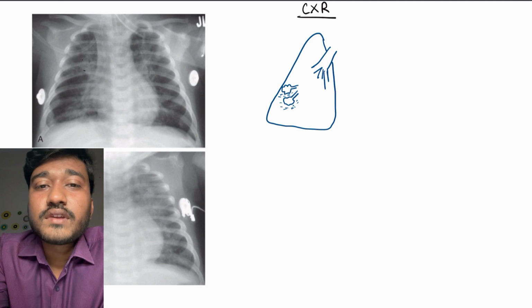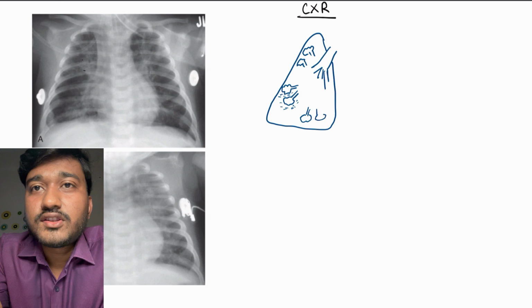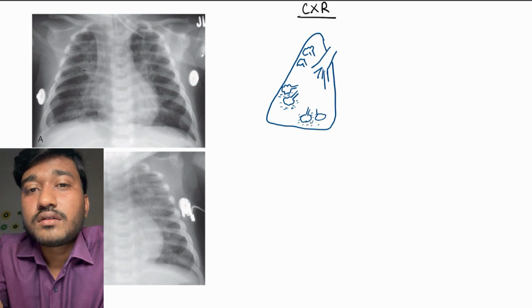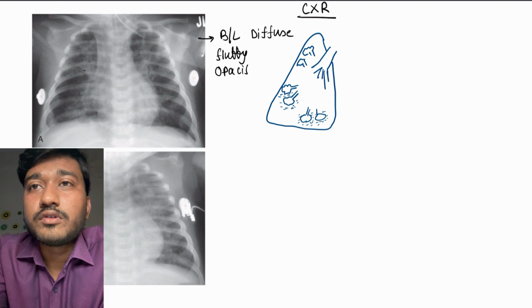In chest X-ray, please remember, according to differential radiographic density theory, fluid will appear as white. In the lung, please see what happens in this case. There are bilateral patchy white opacifications that you can see. These are due to interstitial inflammation, as well as fluid collection. This typically happens in viral pneumonia.